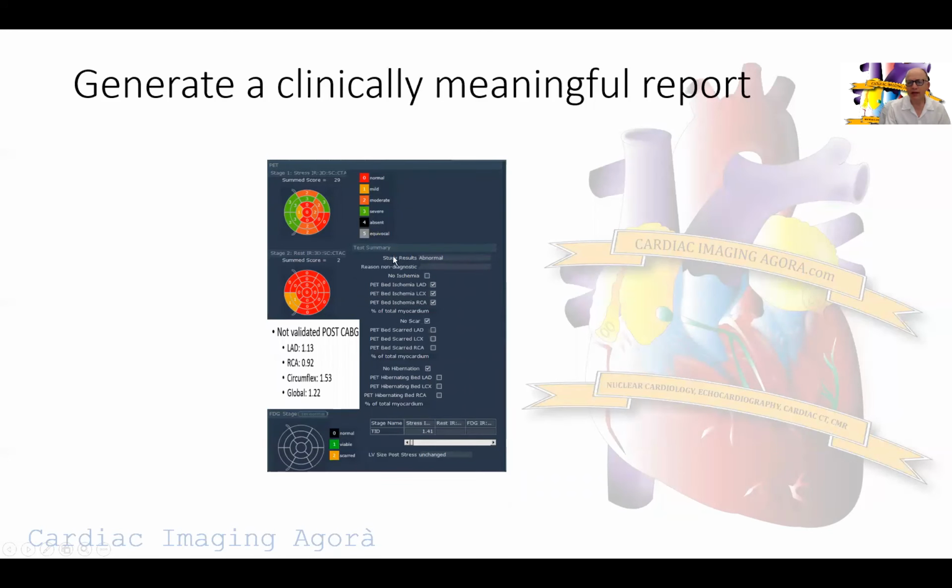We fill the scan. Again, we already coded this part. It shows up here in our database. So a physician who's referring the patient can see exactly what we called and where we called it. And then we call this area ischemia in the LAD. There's anterolateral ischemia, we call it part in the circ, and the RCA. We called no scar here because this area of uptake here, we call it all ischemic. So there's no hibernation scar.